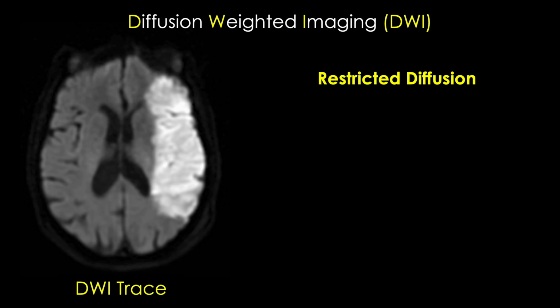So now that we can identify abnormal restricted diffusion on our images, let's look at some pathologies which cause this phenomenon.